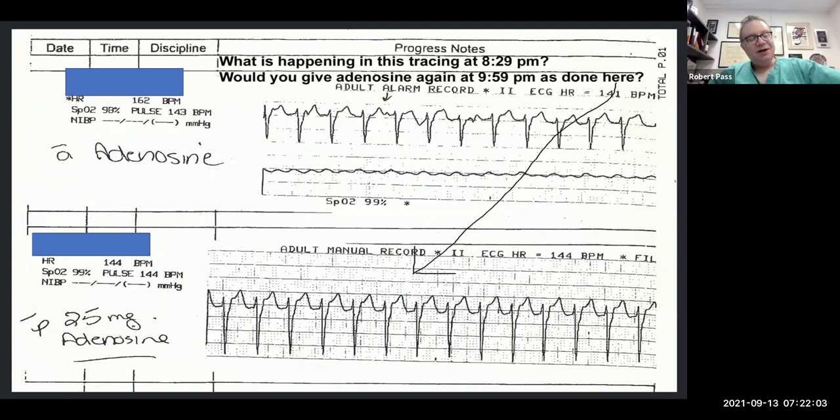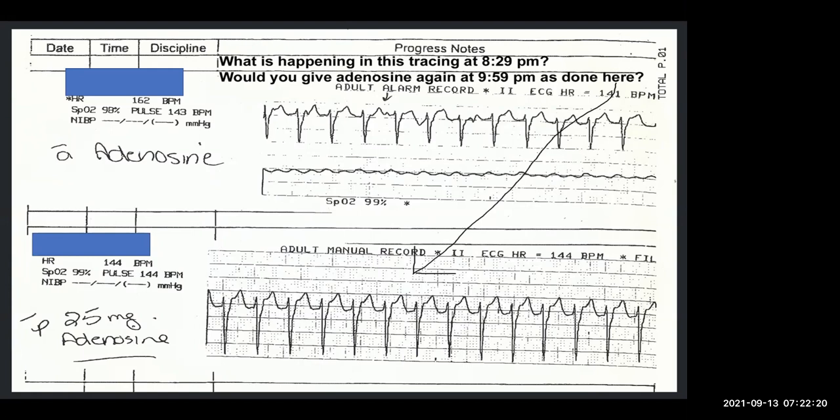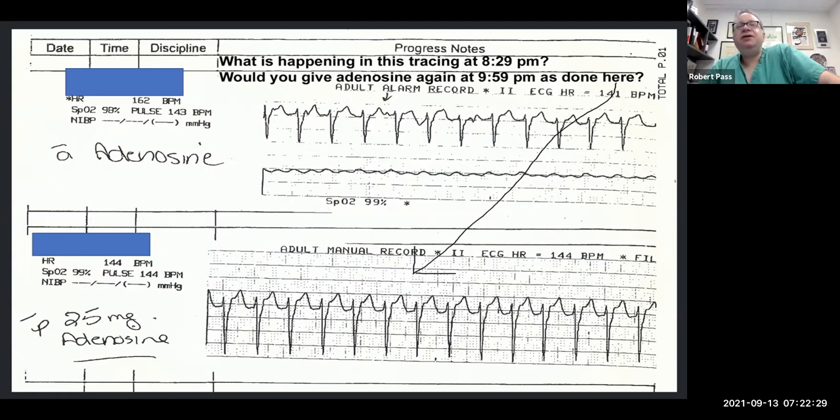No. And in the old days, when Dr. Quagabor was still operating, he rarely placed wires on patients just to make it interesting for the electrophysiologist. So what are you going to do to figure this out? Well, if it were VT, what would the QRS morphology look like?